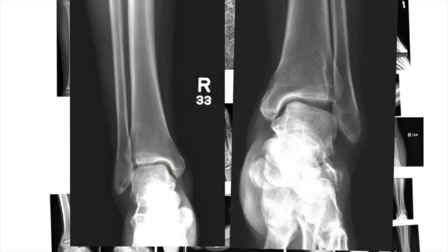Then when you look for fractures, it's important to follow the cortex or the edges of the bone and make sure that it's smooth. It should always be smooth. Whenever the edge of the bone is not smooth, whether it's in the joint space or it's along the cortex, that's bad. And I want you to think of skeletal radiology as either you're looking for things that are good, smooth, or bad, not smooth.